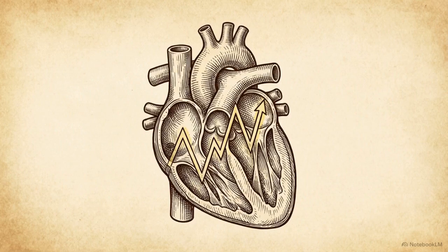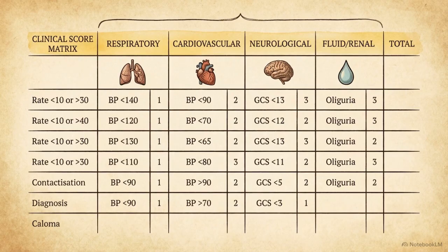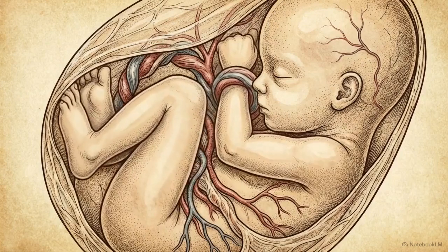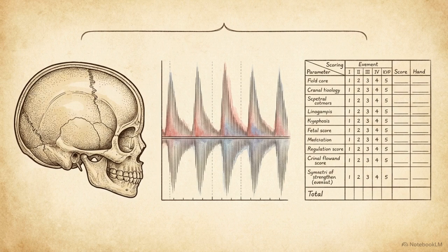Those rapid acute events are contrasted by a single, slow-developing indicator used to assess chronic hypoxia, the presence of at least 1 pocket of amniotic fluid measuring greater than 2 centimeters. If the fluid volume depletes, resulting in severe oligohydramnios, alongside a restrictive anatomical measurement, it confirms a long-term pattern of placental insufficiency. Synthesizing anatomical biometrics, Doppler indices, and physical parameters provides the data necessary to evaluate the systemic mechanics of fetal survival.